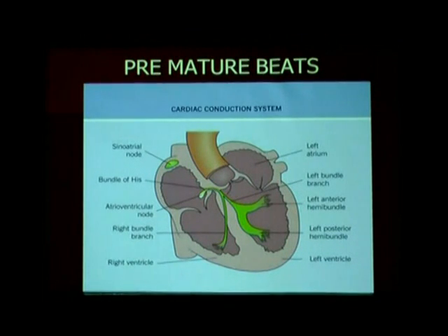Then we come to the most difficult part, arrhythmia. What is an arrhythmia? Any rhythm other than normal sinus rhythm. 6 criteria for normal sinus rhythm: upright P in L1, inverted in AVR, constant PP cycle, constant PR interval, constant RR cycle, heart rate between 60 to 100. Any rhythm which does not satisfy even one of these criteria is an arrhythmia.